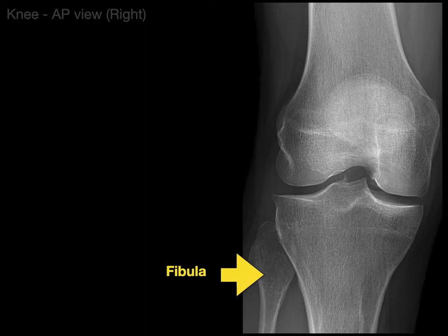It's always as if you are facing nose to nose with the patient, in this case, this x-ray. And I recognize it's not the entire patient, it's just their right knee. But it's in anatomical position, as if you're facing the patient and you see this patient's right knee. That's why the fibula is lateral.